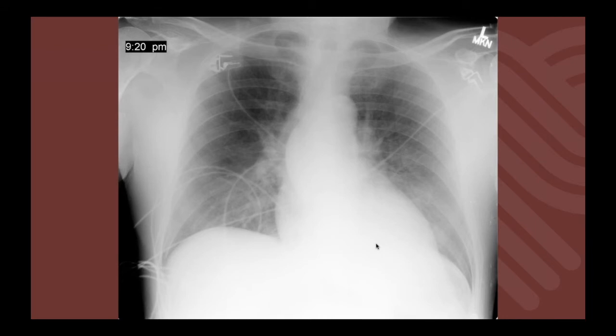This, I think, is a very nice X-ray for any trainee on the call. There is a prominence of the ascending aorta. With the chest pain, we need to rule out some sort of aneurysm or dissection. Yeah, very good. But more than prominence, it's hard to describe that at first until you really look into it. We have almost like a silhouette sign.